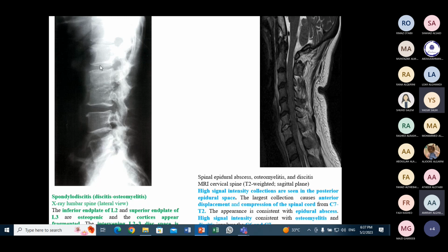In the lumbar vertebrae, it is best to identify the superior and the inferior. What is this vertebral number? This is 5, so this is 4, and this is 3, and this is 2. So the abnormality is in which vertebral body, or in the disc space? Yes, the abnormality is here, between 2 and 3. Look at the disc space.